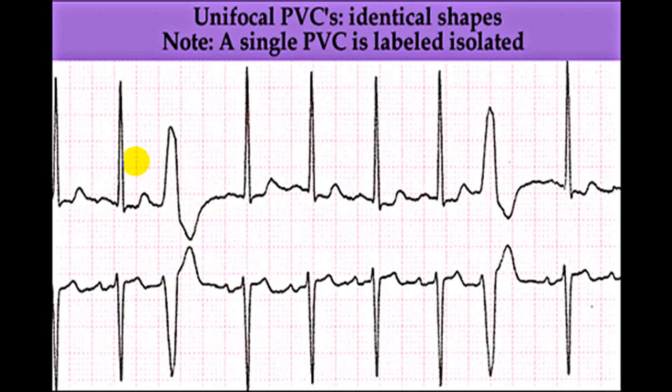So this is a ventricular premature beat. And this QRS complex is coming early because if you take this RR interval, it should come somewhere here. So this has come a little early. So this is a premature ventricular beat, or ventricular premature beat. And it is followed by a pause, and this pause is a complete compensatory pause. That's why it is called a complete compensatory pause. We'll explain that in another lecture, the extrasystole lecture, where we'll explain what a compensatory pause is, etc.